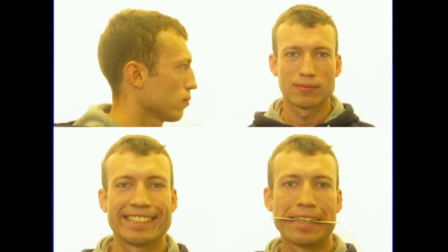So basically, I'll just do this. Finished. The important thing for me in this case is incisor position. Because if you do this and you correct it, the incisor tends to go towards the side you shorten. So make sure if you do that, bring it back to the middle.